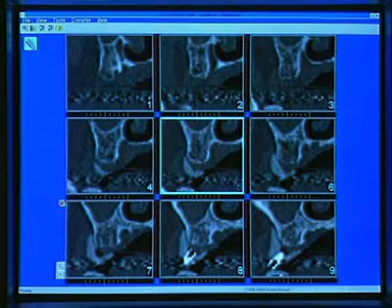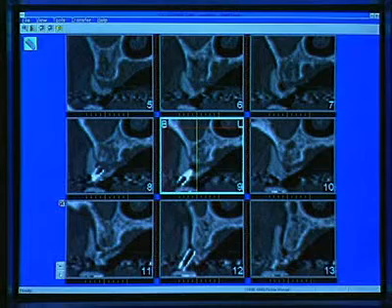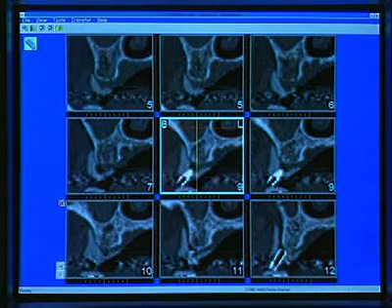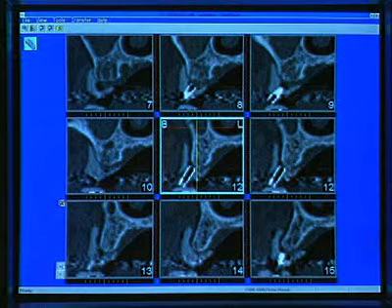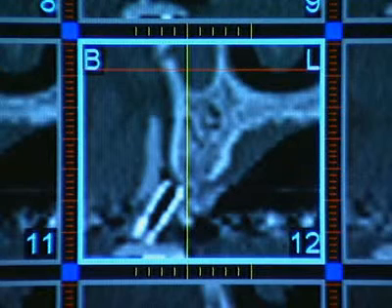Now we will pick out these cross-sectionals that include the titanium cylinders and thus the planned implant sites. Section image number 12 shows a titanium cylinder over the alveolar crest in its correct axial direction. Well-structured additional measurements can be performed via the tool functions.